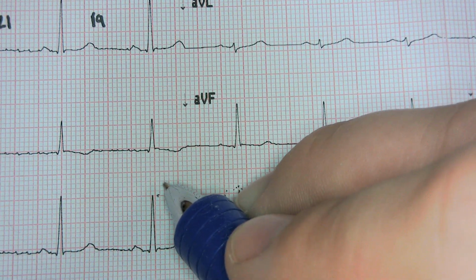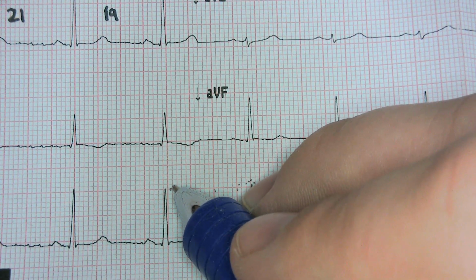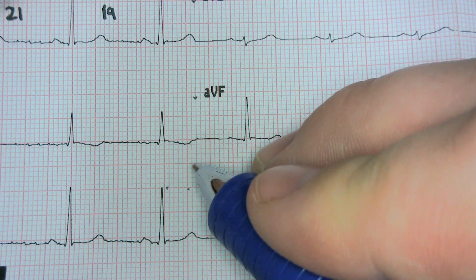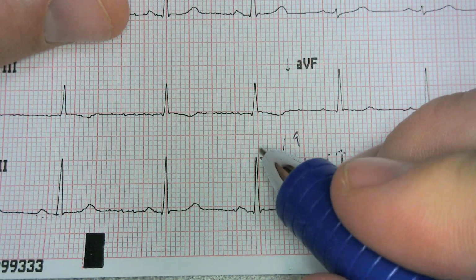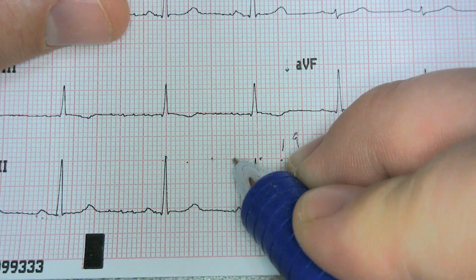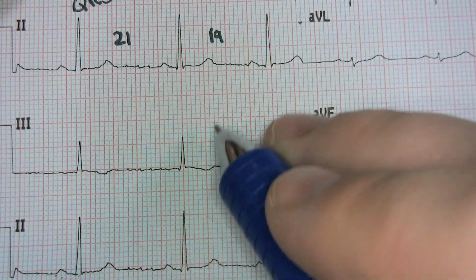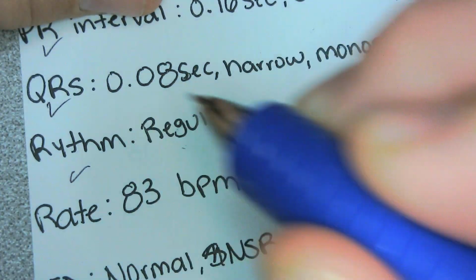Now this is one of those that's pretty much right in the middle, so you could call that 18, you could have called that 19, depending on how you want to round it. I guess maybe it's a hair close over here, so I'll call that 19. Then I'm not going to count it when I go this way. Look at this, what a gift, right on the crossbars. So 0, 5, 10, 15, and then we said 19 right here. And we're back into where she's done. So yeah, this is a regular rhythm, which is exactly what she said. Excellent job right there.